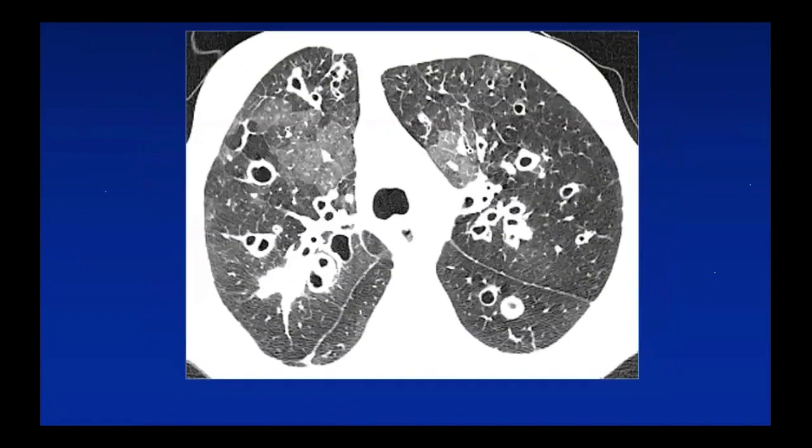This is a different patient. Okay, notice that there are darker areas and denser areas. Now, which is normal and which is abnormal? We can't just say, well, this looks really dense, so it's ground glass opacity, because then you're going to misdiagnose it. And frequently, this is called ground glass opacity. So look at the vessels. So these vessels here versus the adjacent vessels, look at the vessels here. These are smaller. But again, that is really hard to tell. And frequently, I can't tell the difference.